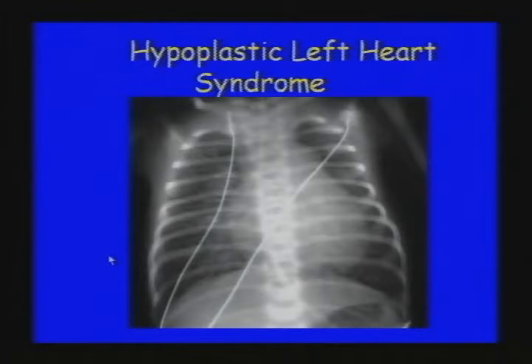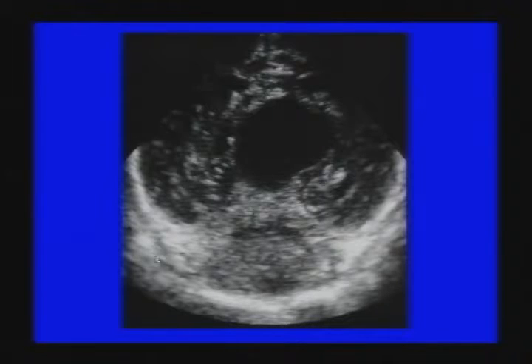Here's an example of a child with a large heart and vascular congestion, and this one turned out to be hypoplastic left heart syndrome. But this particular baby, the first one I showed you, was also noted to have a cranial bruit. And here's the head ultrasound, coronal, here's cerebellum, temporal lobes, and you can see this large anechoic mass in the incisural region that when you turn Doppler on this sagittal image here, cerebellum, nose is over here, you can see this marked Doppler flow within the lesion.